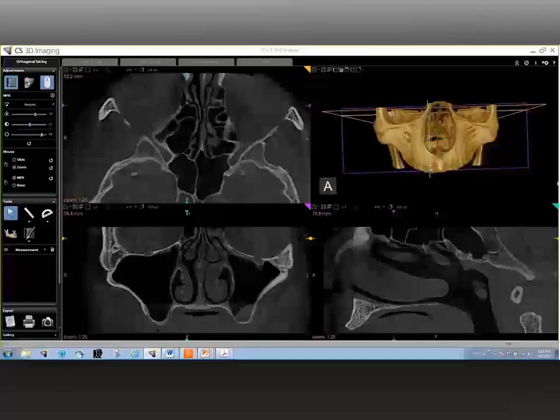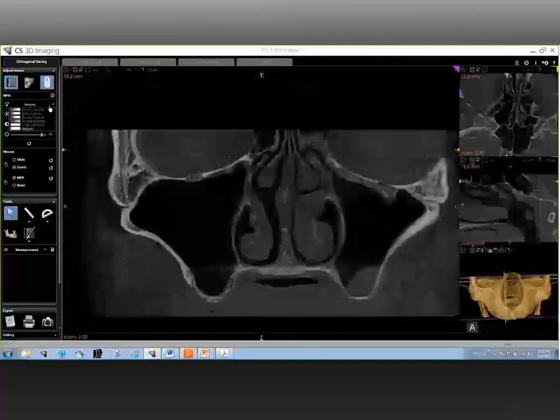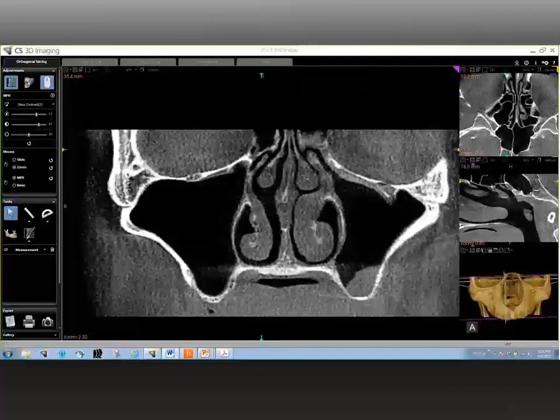What are the important anatomical landmarks of the maxillary sinus? One of the easiest ways to look at it, there are not a whole lot of landmarks to evaluate, but the ones that are there are very important. Firstly, when you look into the sinus, you see the floor of the sinus. The floor of the sinus is very simple to identify. It is nothing but the most inferior point of the sinus. And then you have the lateral wall of the sinus right there. And then you have the roof of the sinus, which is the topmost extension, which also borders with the infraorbital rim, or the lower border of the orbits.